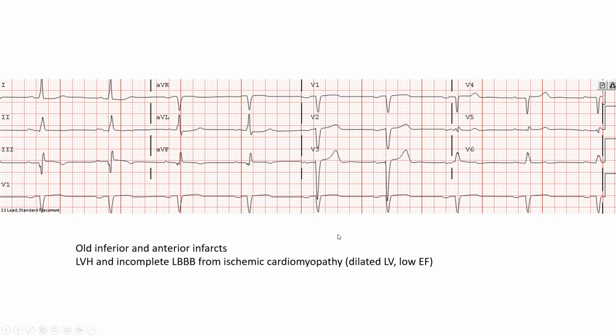Then there are also other criteria that I will explain later, such as when you have a Q wave infarct, the upslope of the R wave in leads 1 and AVL may become notched or fractured, as is actually the case here. In conjunction with left bundle branch block, that can indicate an infarct. Also, the upslope of the S wave in leads V3 to V5 may become fractured. That's not the case here. But at the very least, realize that yes, left bundle branch block can give you QS pattern in some leads, inferior and anterior. However, it does not give you a QR pattern.